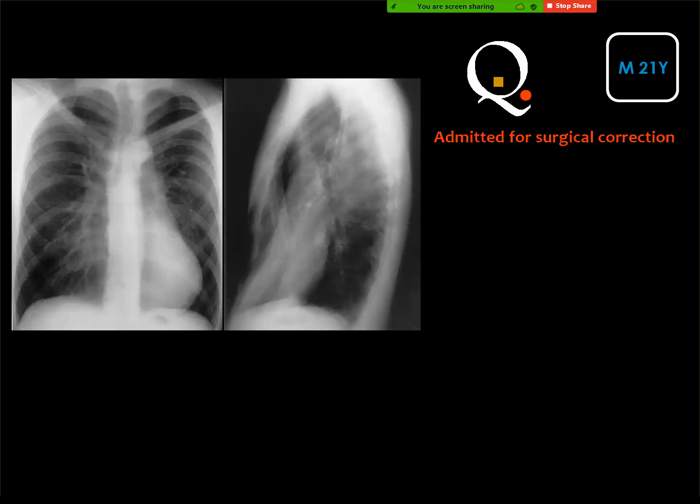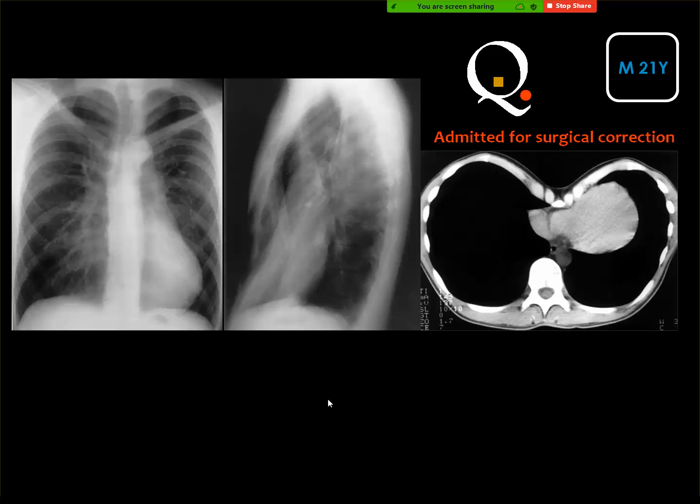Pectus excavatum. Very good. There is shifting. Yes, and shifting of the cardiac shadow. Pectus excavatum, and frequently this is the only projected X-ray in the exam. Then you should feel that the cardiac shadow is shifted to the left side and nothing of the heart is to the right side of the spine.